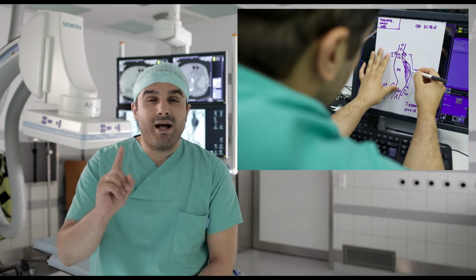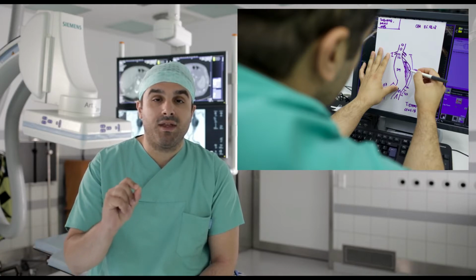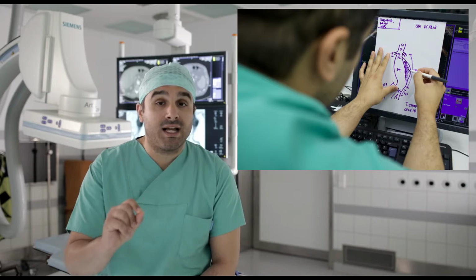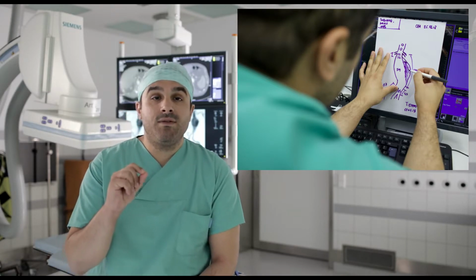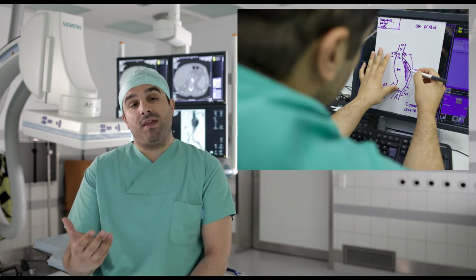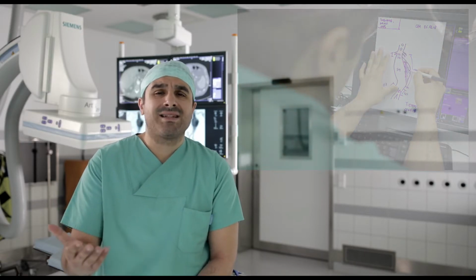There is only one time that you are really focused on the measurement and planning of the abdominal aortic aneurysm, and this is always the first time of your planning. Third, you receive directly a feeling about the anatomic challenges of the aneurysm, like angulation, type of neck, access vessels, tortuosity, etc. So let's go through an example of a AAA.